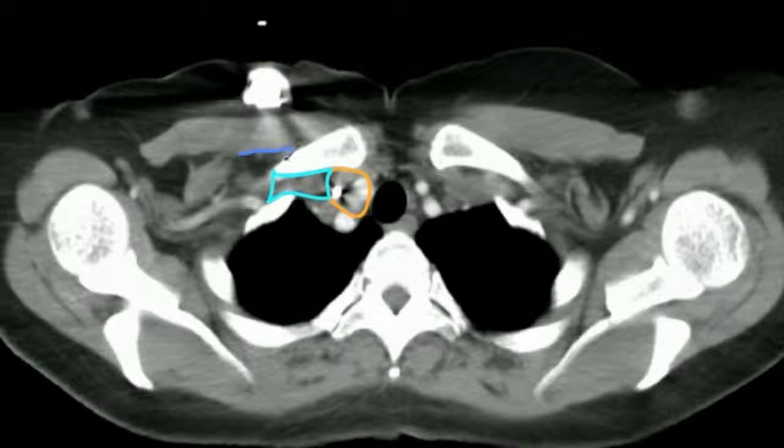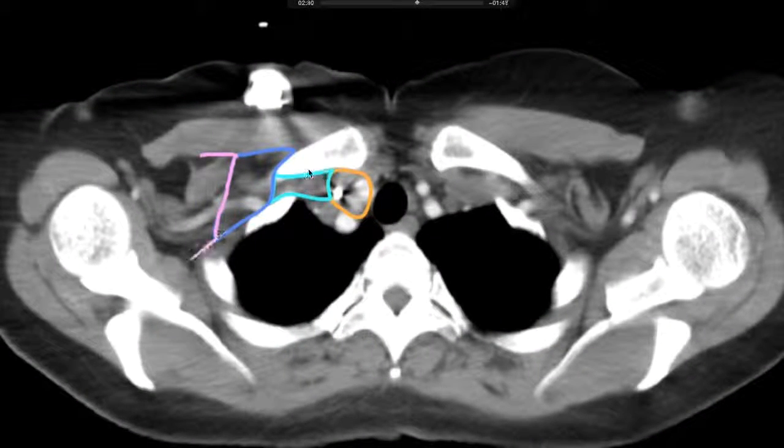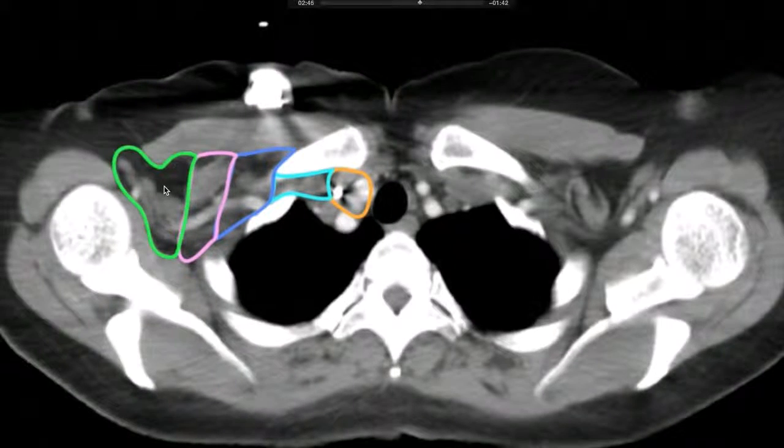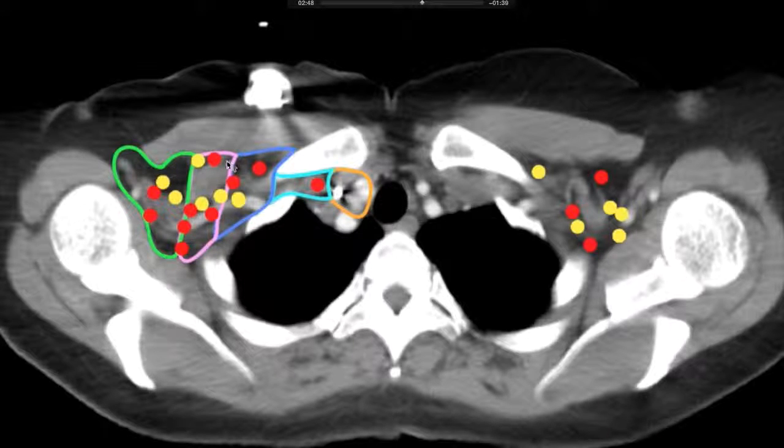Here the lateral SCV area, which is simply lateral to the sternocleidomastoid, is more accurately the postclavicular area, which now connects to the axillary levels 3, 2, and 1. Notice axillary level 2 includes the intrapectoral space between pectoralis major and minor.